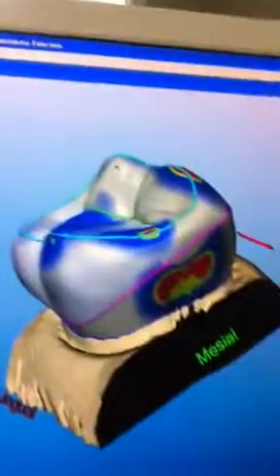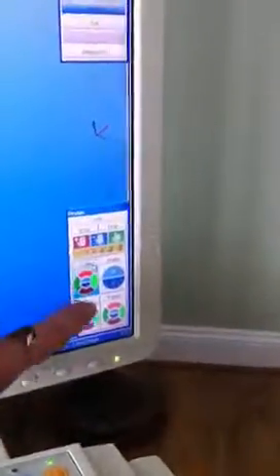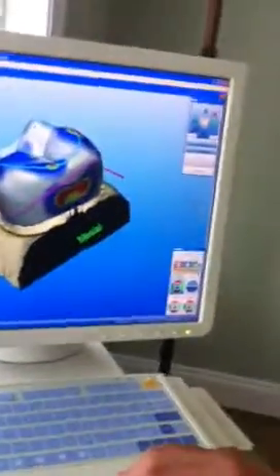So if you were using these, you'd click on a line over here, and if you were using this, you'd click on another line over here. Right. If you were using the form tool, watch whenever I click on form, because you actually have to click on form to engage it. It's going to take those lines away. Okay. And then. Oh, I see. Okay. So they almost should have separated these right here, this from that. They should have. It would have made it easier.